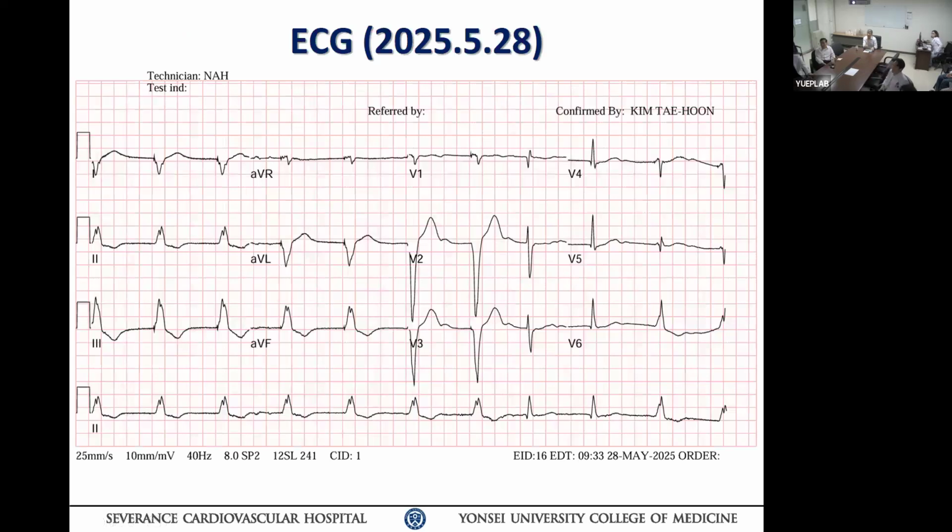This is the electrocardiogram we will discuss today. Dr. Kyo, what do you think about this ECG? Dr. Phil, will you please speak louder?